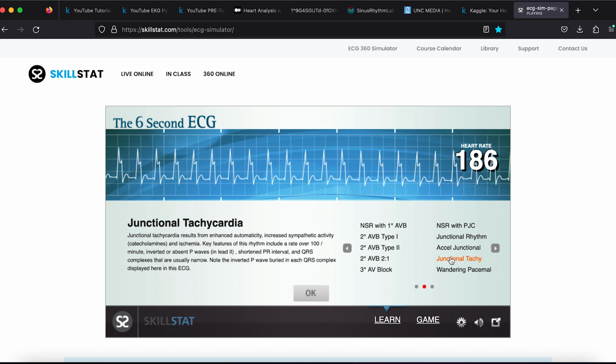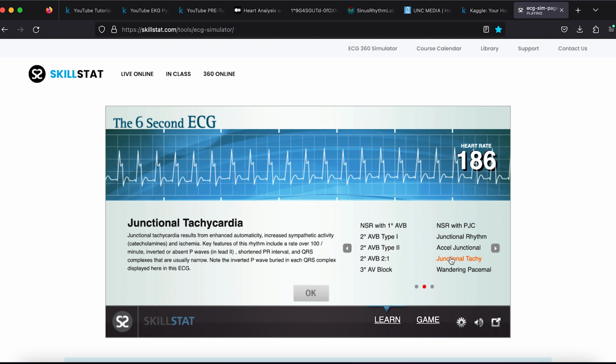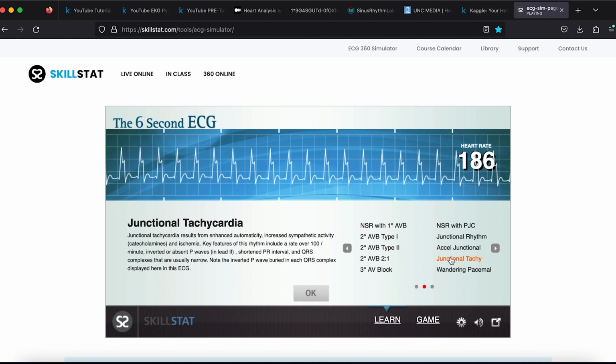Arrhythmias tend to look like this. They'll have some portion of the spike, but it'll be exaggerated, or it'll be too wide, or waves will be missing, or there'll be extra waves.